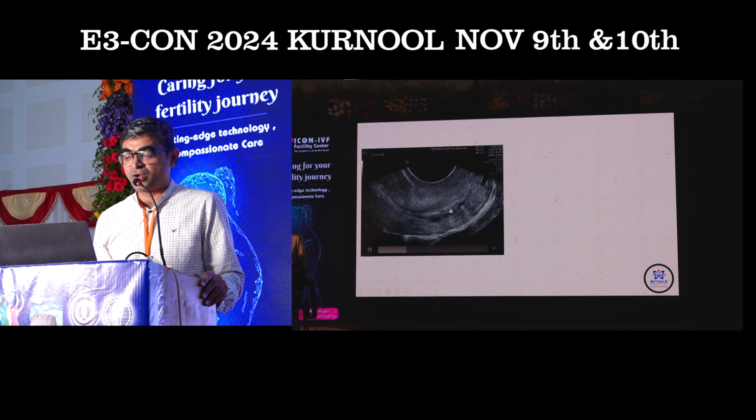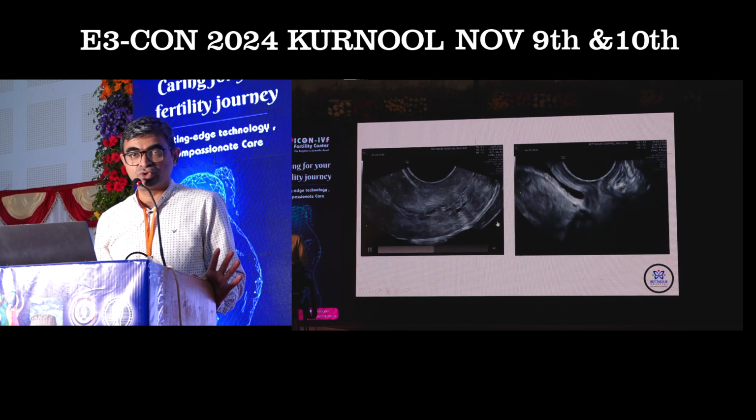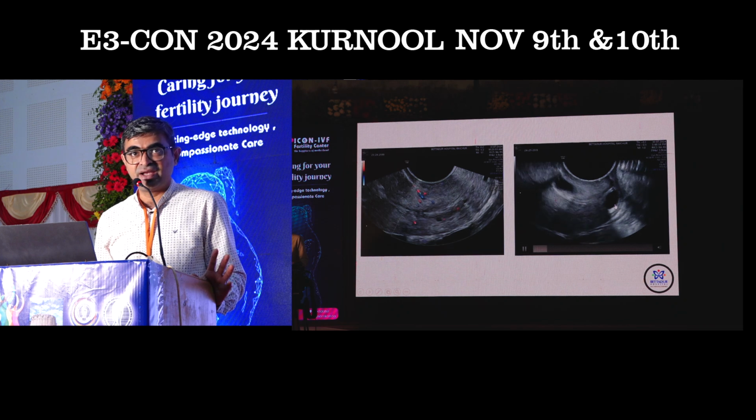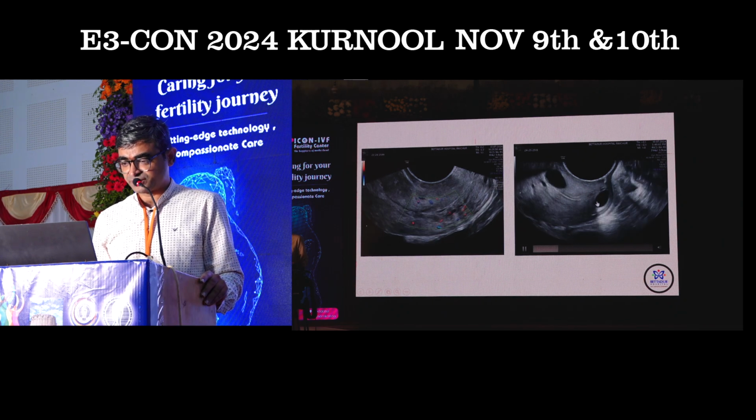Sometimes they might be seen deeper in the stromal entity also. These are benign lesions, anechoic cystic lesions. Sometimes they might show posterior acoustic enhancement, but they don't have any vascularity, and they are all benign lesions. These are very common, which you all see.